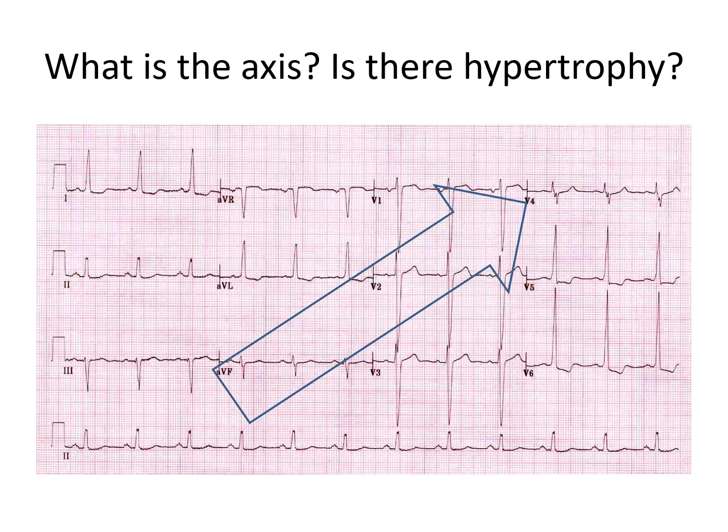This is a case of fairly classic left ventricular hypertrophy. Let's work out the 2D and the 3D vector of depolarization first. We look at lead 1 and we see that it's strongly positive, so it means the electricity is going leftwards in the horizontal plane. We compare lead 2 to AVL. Which one is bigger?